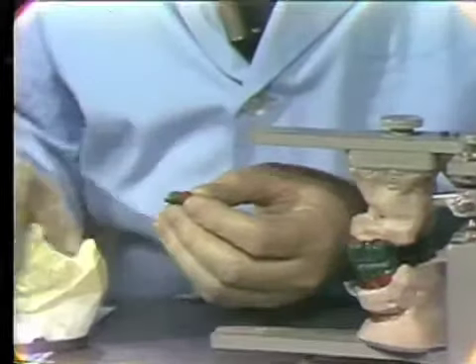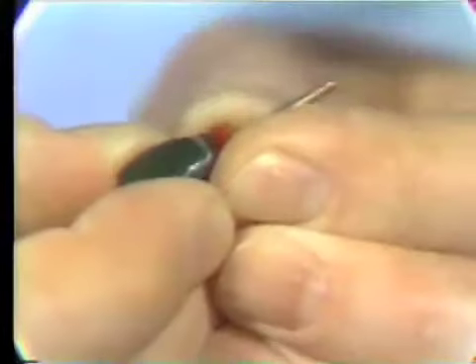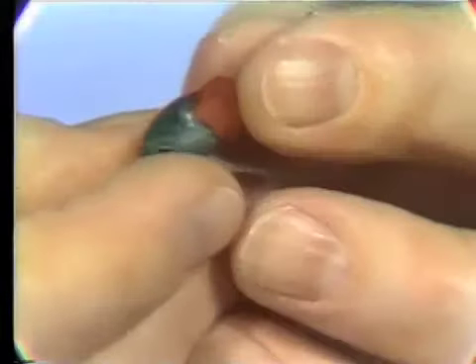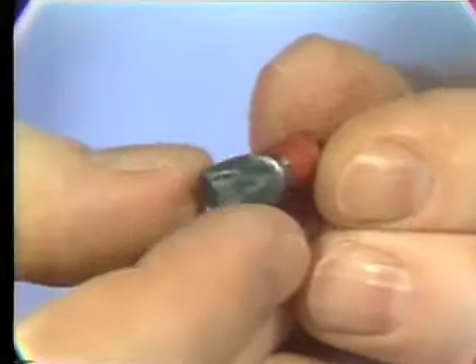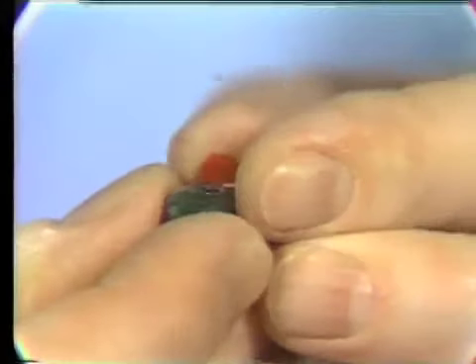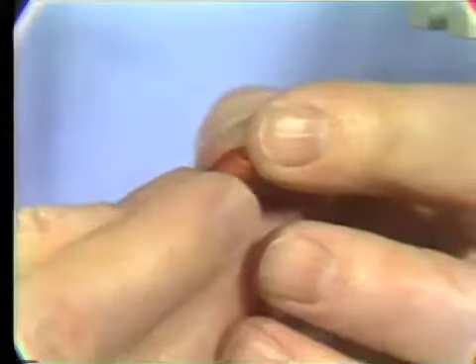And make sure that the margins are waxed to the margin of the die that we want for our finished casting. So check around the margins. Now there's an area where they're over-waxed. This would want to be cut back before the casting was made so that we wouldn't get a bend in the margin. So each die, each wax pattern should be checked for the accuracy of the waxing to the margins.